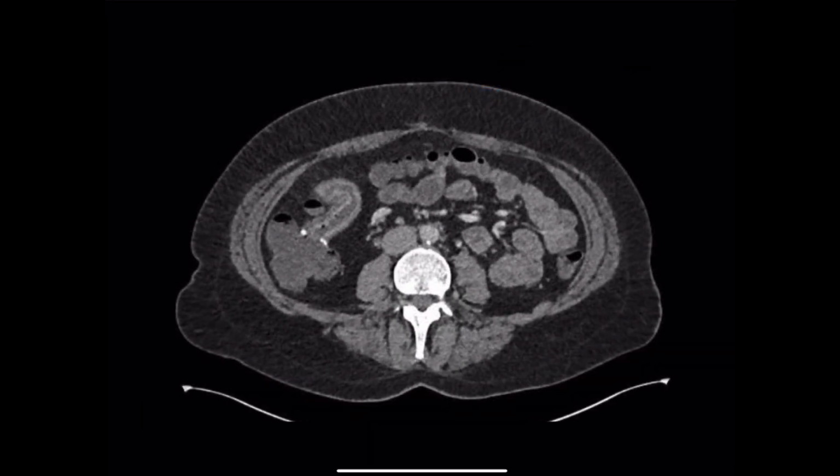So here's another axial view of one of my patients. And she had inflammatory bowel disease, more specifically Crohn's disease of the small bowel. And that part of that bowel was resected successfully. And what happens is when you join up, you have a neo-terminal ileum. And she's back with a lot of distension, abdominal discomfort, and a change in bowel habit. And that's put her off her food, and she's lost a lot of weight.